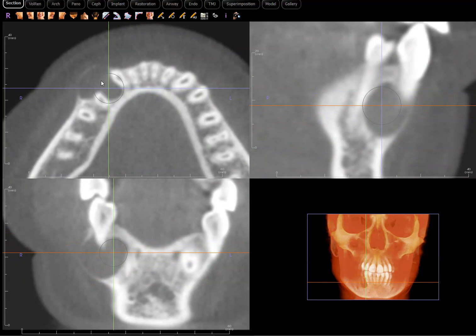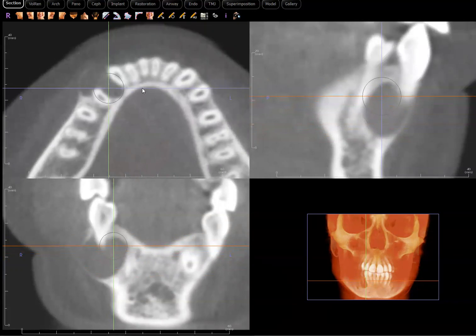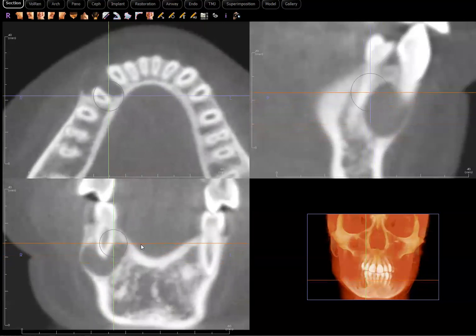view adds is the buccolingual appreciation of the lesion. We definitely saw the lesion, its mesiodistal extension. However, we were unable to visualize its expansion in buccolingual direction. And we see that there is a rather prominent expansion occurring toward the buccal aspect, where we can still see a thinned cortical plate, but it has not been perforated. Whereas the lingual side, it seems to have stopped right at the level of the cortical plate. Okay. And no expansion, unlike the buccal side.